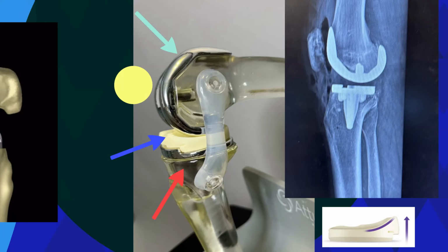In between those two pieces goes the darker blue arrow, which is what's called polyethylene, which is a fancy plastic. That is a material that goes in between the femur and the tibia and really acts to increase the stability of the knee joint and is a low friction surface that the femur rubs on through revolutions. This has been engineered over time to be better and better, and wear rates of that plastic have decreased with modernization of techniques to the point that knee replacements last an incredibly long time at this time.